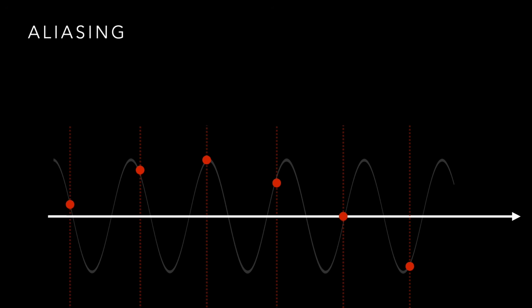If it's set too low, you cannot accurately resolve the frequency that you're trying to detect, and it's going to display it as something different. So this works wonderfully in theory, but where do we actually see this in practice? How does this affect me at all, or is this just a long-winded way of showing some pretty pictures? Where we see this in practice, I'll show you one place, and then we'll take it to ultrasound.